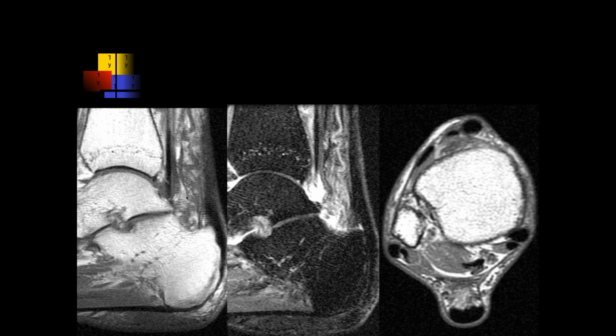Okay, so here is the Achilles tendon coming back here, but let's see. Ashu, what do you think of this case? Looking at this case, I see some signal right within the retrocalcaneal area, right where the tendon inserts, and there's a posterior subtalar joint effusion. I don't see a Haglund deformity. There's some edema also within Kager's fat pad. So I think this is more of a peritendinitis picture.